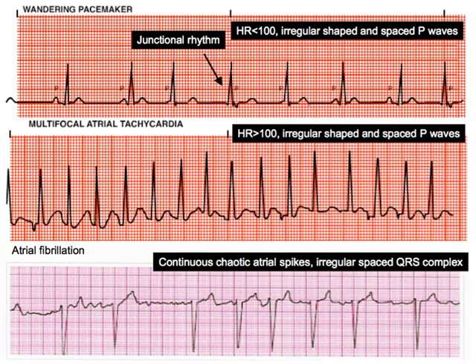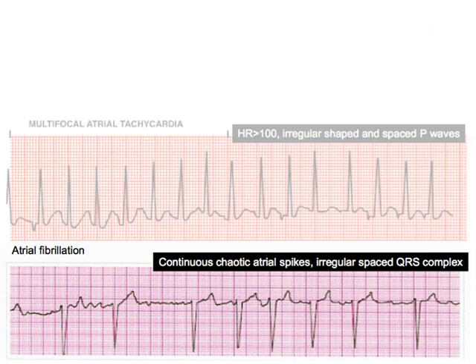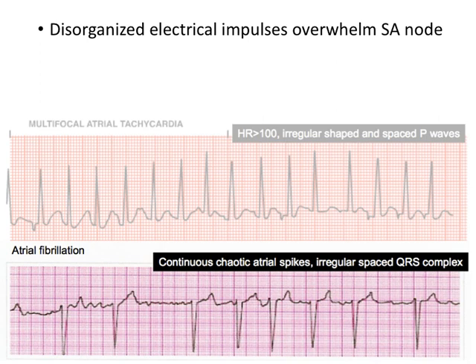Now the third example, which is obviously different than the rest, is atrial fibrillation, and you can see the chaotic nature of fibrillation shown here. Specifically, a very disorganized electrical series of signals. There's no clear hierarchy. There's no firing of nodes in the atria and then the ventricles. There's this scattered, fragmented, almost buzzy sort of background noise.